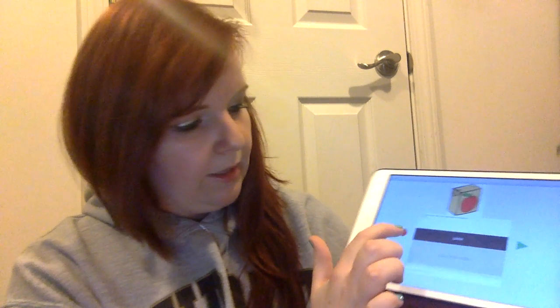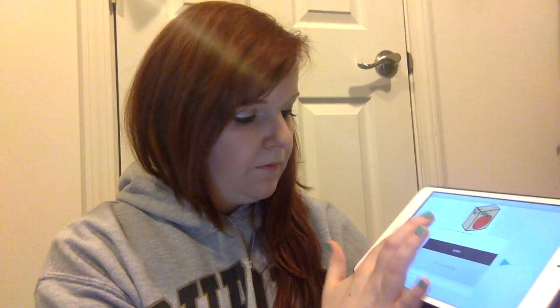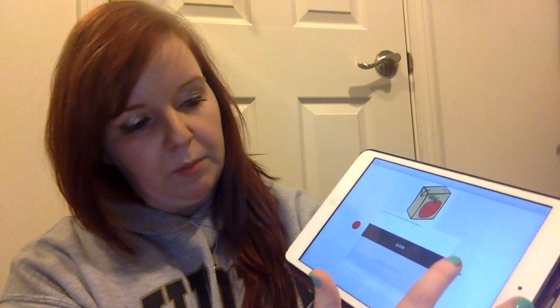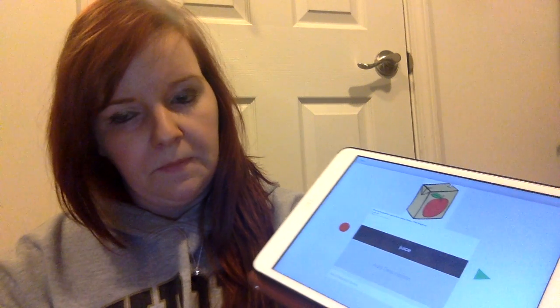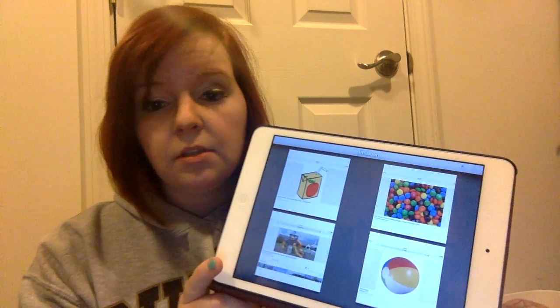And then from there, I can hit the record button and record myself saying juice, juice. And then I'll hit play. Juice. And then there I just added stimuli for my child to go and choose from. So now instead of just having a ball outside and candy, now they have a ball outside and juice.